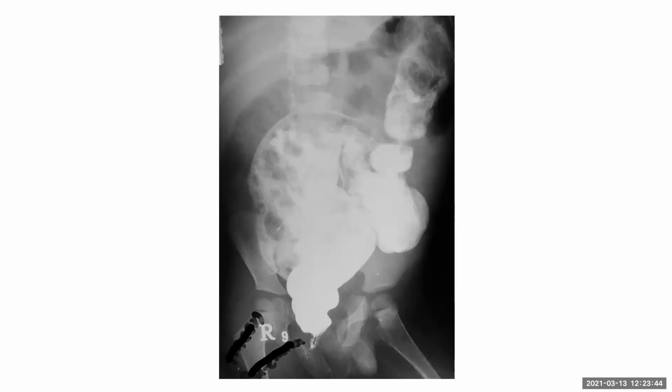These are the contrast enema images of the same patient. You can see there is a gross dilatation of the sigmoid colon with reversal of the recto-sigmoid ratio. I also see a small focus of narrowing in the descending colon.